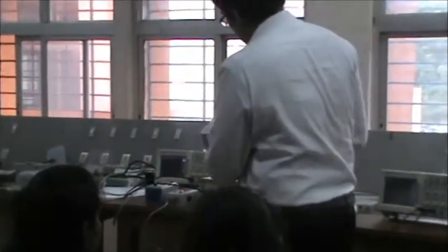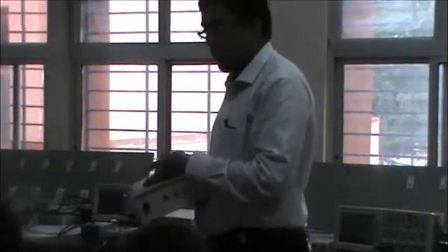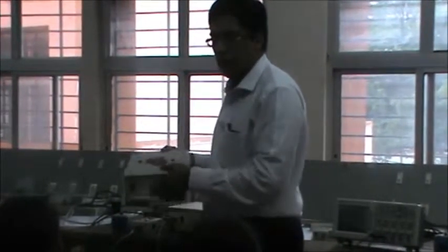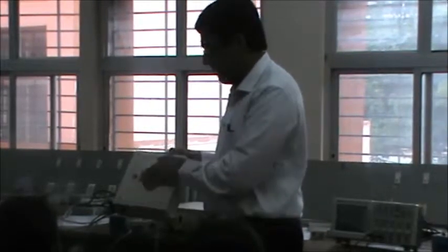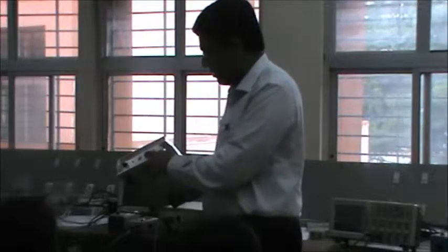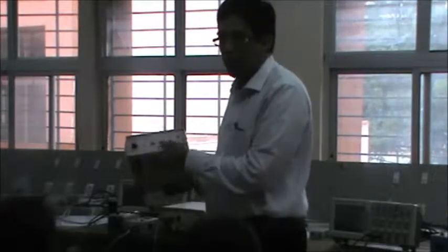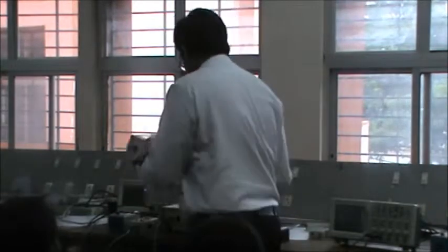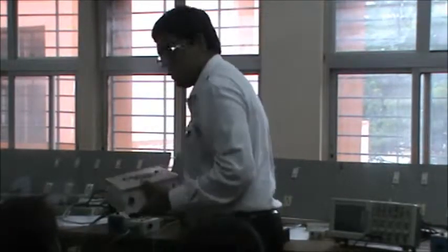We also have a lot of simulators, like the arrhythmia simulator. You need not go and search for data from the hospitals, as you can have a machine which can give you various arrhythmias. Likewise, we also have dedicated simulators like the pacemaker simulator and defibrillator simulator, for simulations of atrial fibrillation and ventricular fibrillation conditions. These are some of the arrhythmias, as we call them. Arrhythmia means anything which is abnormal.